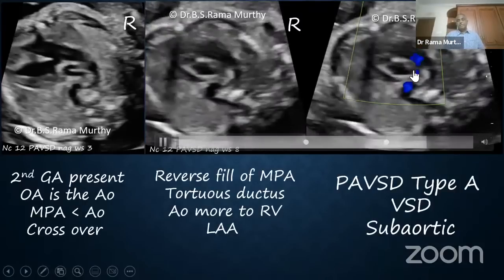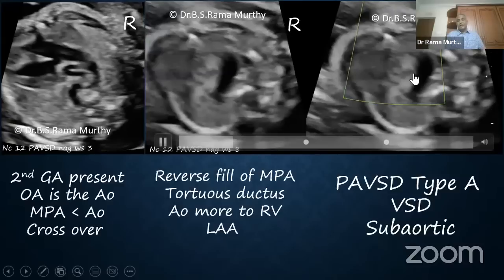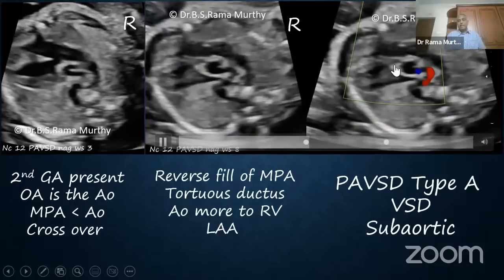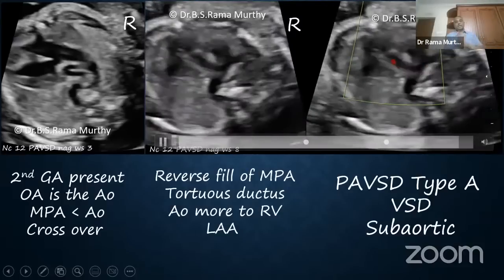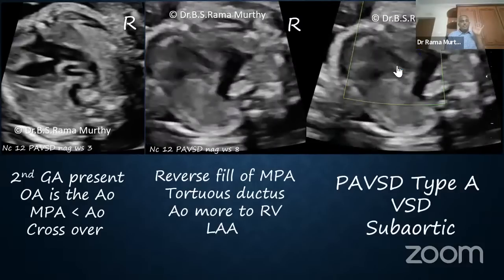Instead of this being blue, that is being perfused by the ventricle, it is getting supported by flow through a tortuous ductus in the reversed fashion. Immediately telling me that this is not tetralogy of Fallot, this is a pulmonary atresia with a VSD.